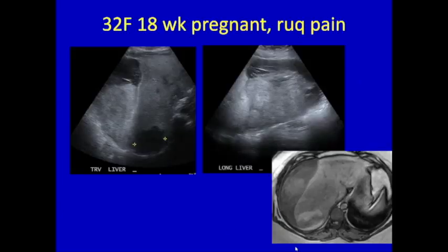Other things that can bleed, this is another adenoma. This patient is pregnant, right upper quadrant pain.